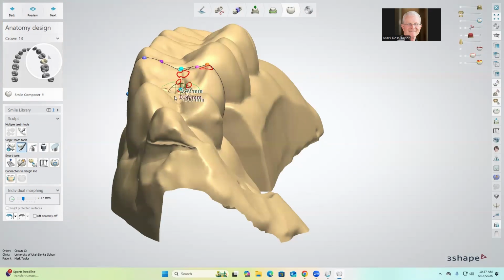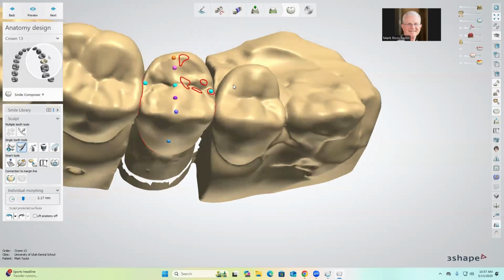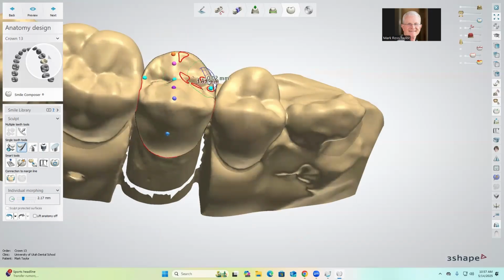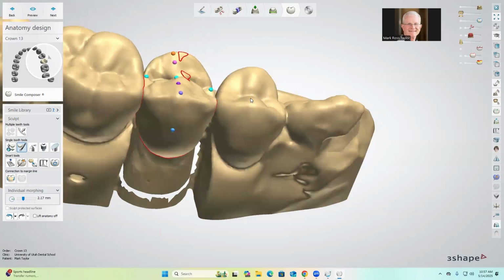That's something you will have to adjust based on what you want. Me, I like something more in that central region, but that's a personal like or dislike. You definitely don't want it on slopes.